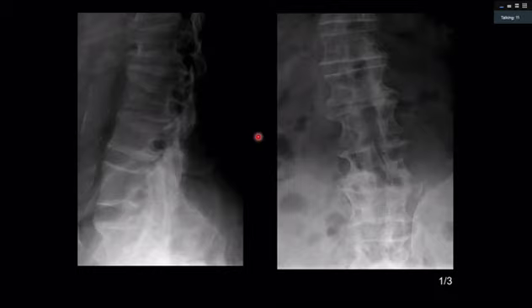I think that's the main abnormality that I can see. So what is your conclusion? So in summary, there is posterior vertebral body scalloping and likely a secondary deformity in the alignment of the lumbar spine. My differentials for this would include a neural-based pathology such as neurofibromatosis.